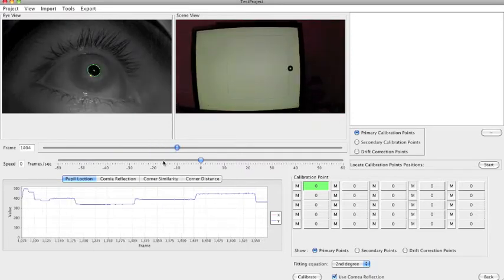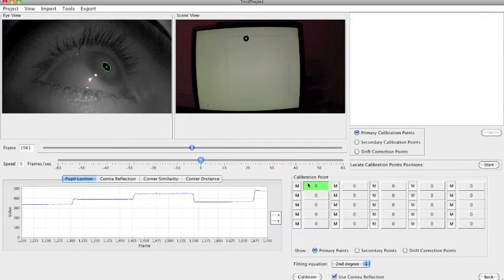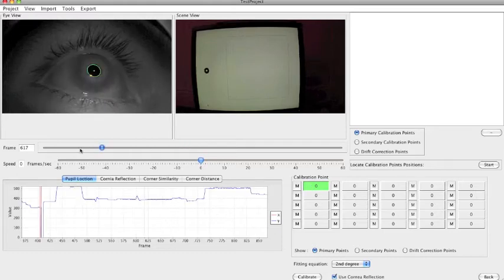And this other slider is going to allow you to actually play a number of frames. You skip it. As you can see, now we're playing 20 frames, 30, and so on. Here we have just coordinates. These coordinates for calibration have nothing to do with the actual calibration. What we use them for is as a reference of where we're actually putting the calibration points. You will see that will make sense whenever I start doing it.